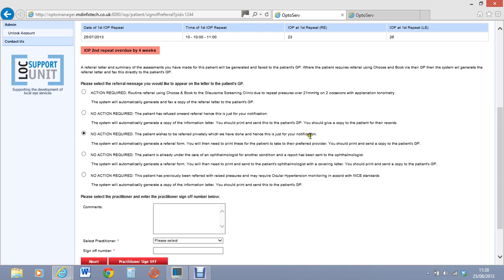Alright. The other one that no action required is that the patient wishes to be referred privately, which we have done, and hence this is just for your notification. So they say to you, yeah, Miss Jackson says, I don't want to come in for a repeat measure. I wasn't happy with how it was done, whatever, or I'd like to go and see Mr. Salmon privately if that's okay with you. I'm a little bit concerned, so I don't want to have the second repeat done, but could you send me privately to Mr. Salmon? You write a private referral, set up a referral with Mr. Salmon to go see him at the Manor Hospital. Then you'd click that one and just say that you've referred them on.